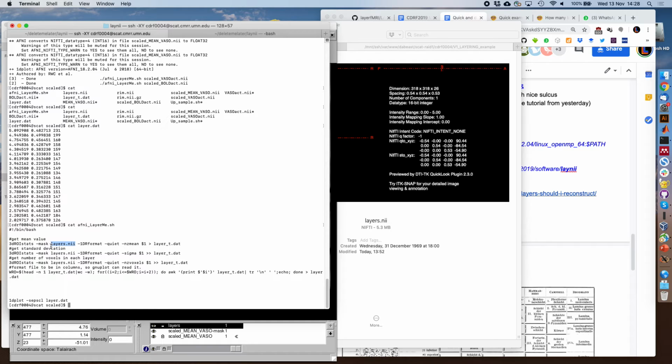I think we always need to convince ourselves, not only from the resolution perspective, but also from the vascular density perspective. We need to make sure that any result that we see is not just a scaled version of the vascular density. So whatever you do, you need to compare it with something, like, for example, two different task conditions. And as soon as those different task conditions are not scaled versions of each other, then we can answer a question. If you only have one task condition, it's hard.